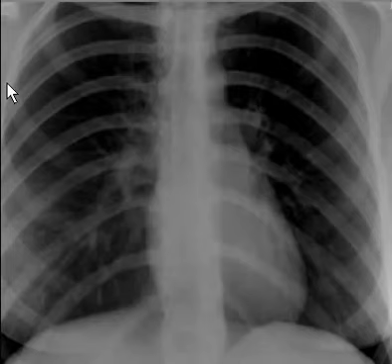The right pulmonary artery is below the right main bronchus, versus left main pulmonary artery is above the left main bronchus. Now this is how pulmonary arteries should be, and confirm that the position of hila, both hila, is in normal position. So this turns out to be an absolutely normal X-ray.